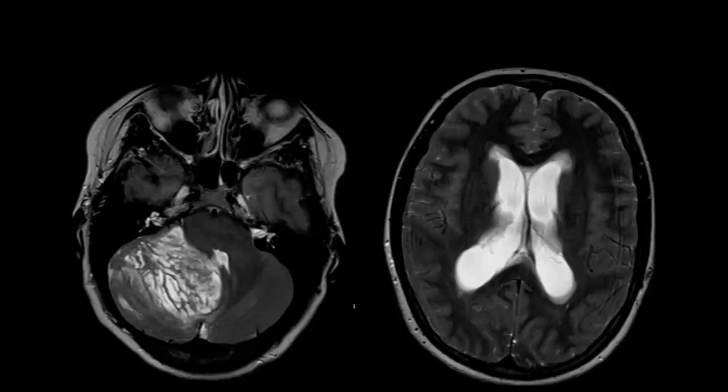Okay, sir, I can appreciate that there is an abnormal signal intensity involving the right cerebellar hemisphere and part of the vermis. It is crossing the midline, and it has hyper-intense signal with internal hypo-intense septations. In comparison with the two images, this lesion has significantly increased in size and is causing a pressure effect on the fourth ventricle with proximal hydrocephalus. No perilesional edema is noted on this image. So this is a cystic lesion with internal CSF signals with multiple internal septations.